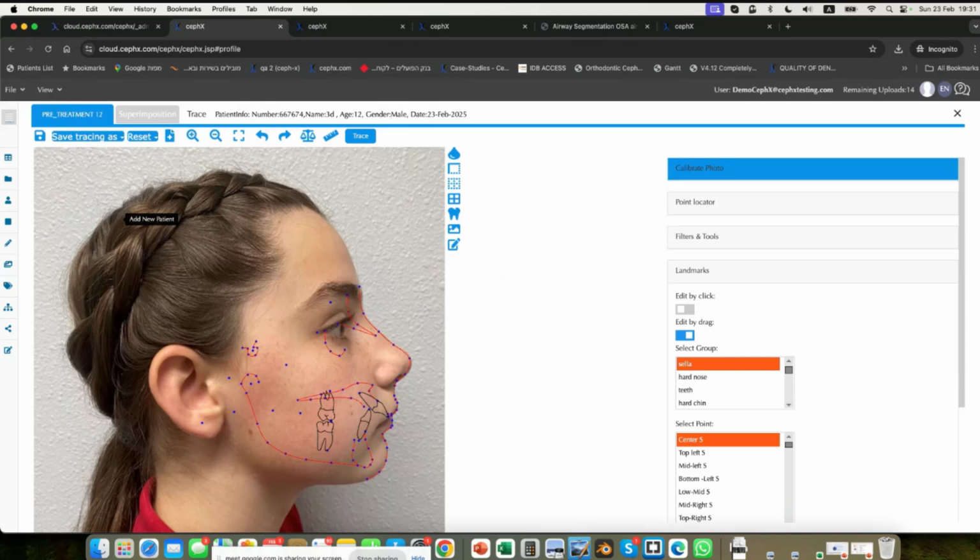Basically, there's a possibility to edit the 3D segmentation as well, but I am assuming that for now it's not relevant to you guys. It's a possibility if something needs to be fixed or changed or updated. It's there. There's a whole set of annotation tools. Because it's 3D, it's more complex than 2D editing of the points. So that's why I don't think it's relevant.